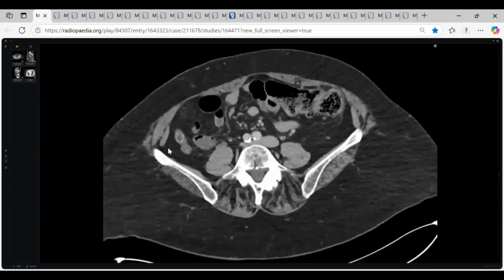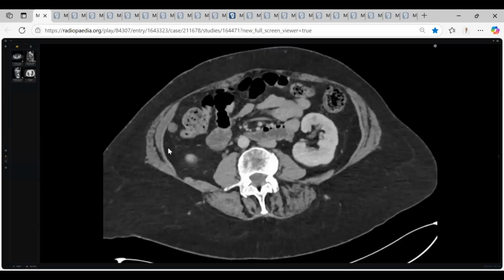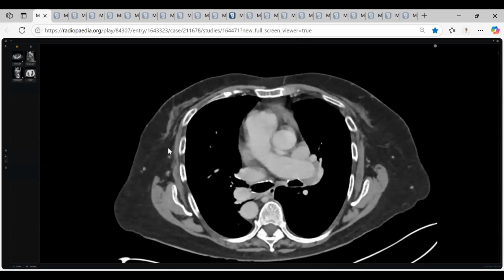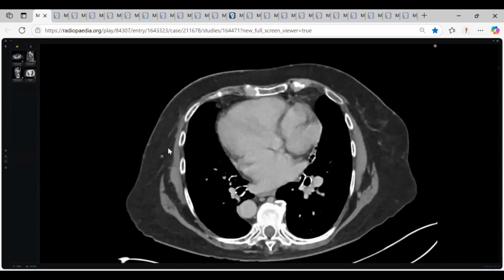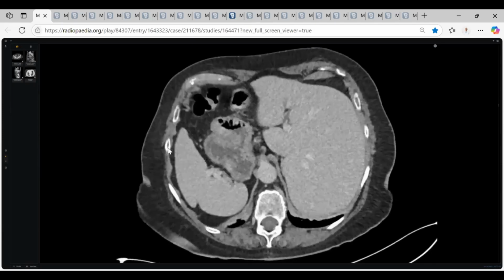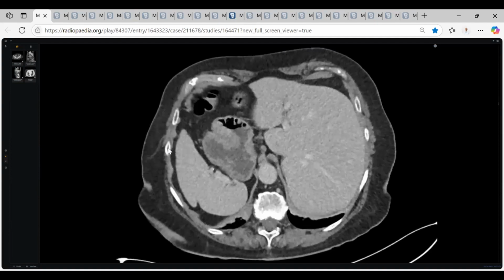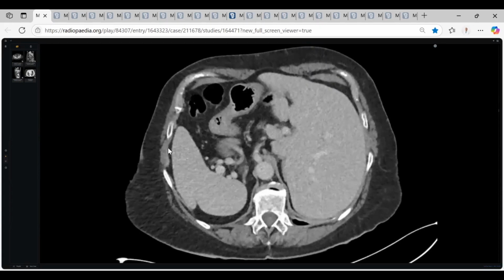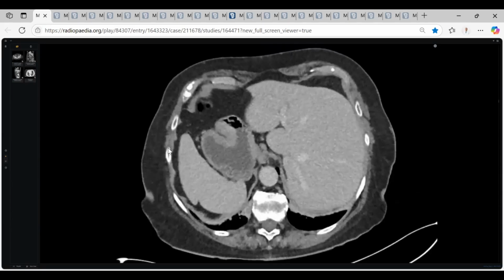Thank you, doctor, so much. I'm so impressed and so happy that you picked up this difficult case. This case is an example of how extensively you should examine, from the first slide to the last slide. The key is not in the left iliac fossa, but from the beginning: situs inversus totalis. The key is here, very important.